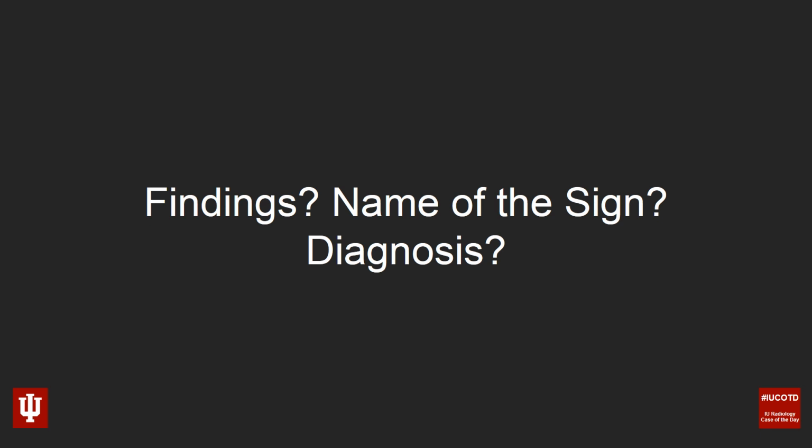Okay, so what are the findings? What's the name of the sign for this radiologic finding? And what's the diagnosis here?